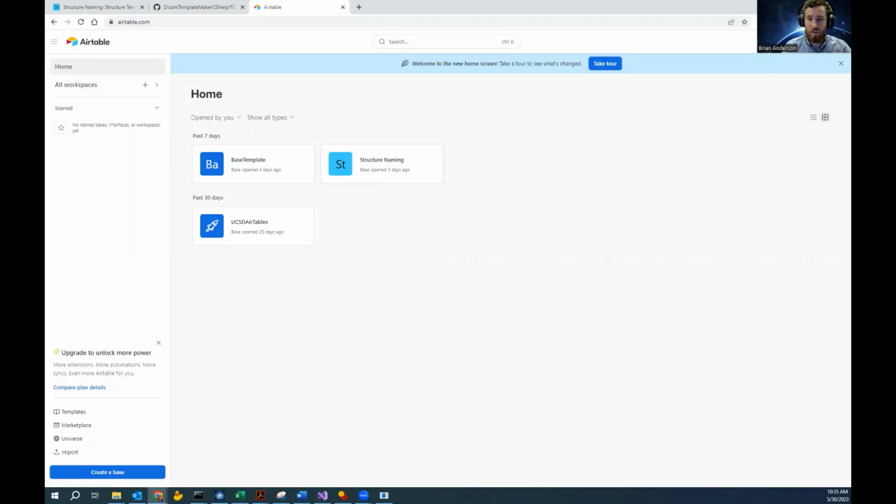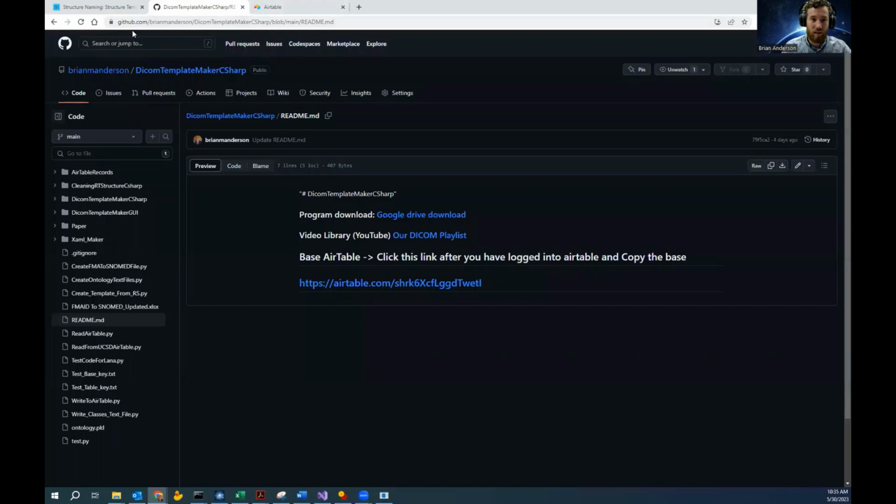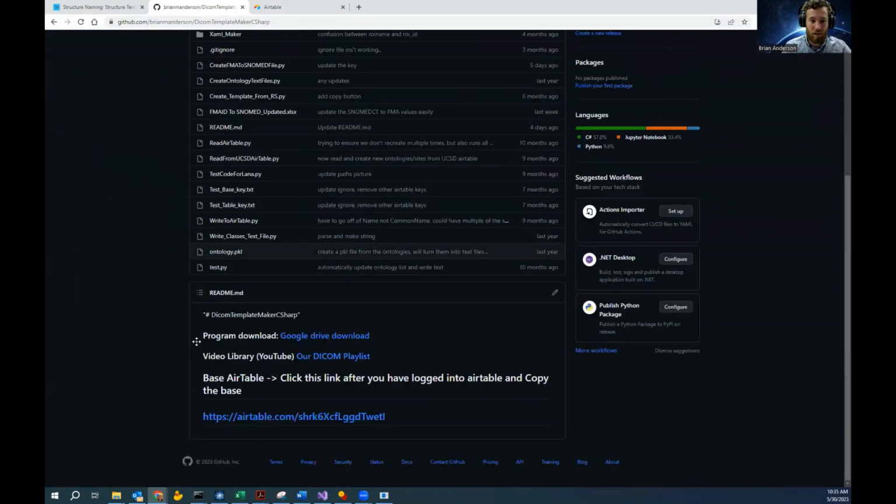So what you're going to want to do is first create an account. Probably just pause the video here if you're doing this because everything after this kind of follows through. So you would create your own account and then come back. And then after you do that, we come to our GitHub page. So that'll be github.com/Brian M. Anderson, and that can take you to the DICOM-template maker. If you then come here and scroll down to the bottom, you'll see this little link that says click on this link after you've logged into Airtable and copy the base.